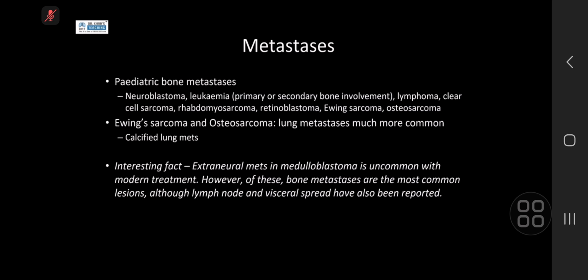So I think that this is a really nice case. Actually, Sam knows this case better than I do. I think the patient had a neuroblastoma, and the example is of a metastatic deposit in the distal femur. So thinking about metastases, I know in children it's not something that we jump to first, but having it there in the differential is really important.